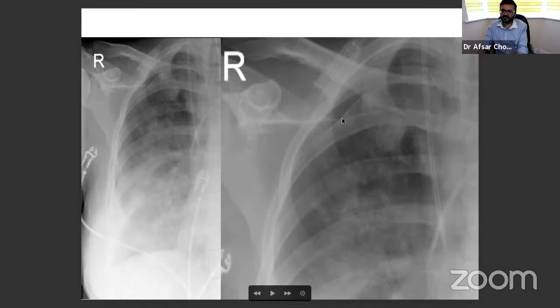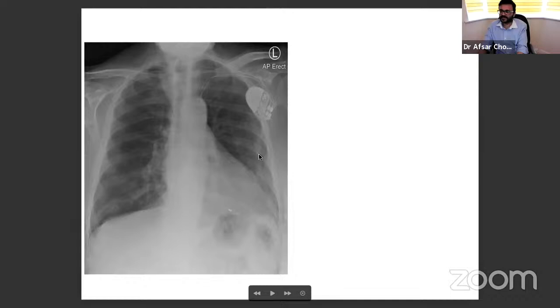But that is described for a proper PA radiograph. If the patient is in a slightly semi-erect or supine view, you can have lung behind or anterior, and some lung markings may be seen. So you should not go hard and fast on that unless it's a PA X-ray. So with a thin line and no lung markings, it is pneumothorax. If it is a thick line, definitely you should suspect a pseudopneumothorax.